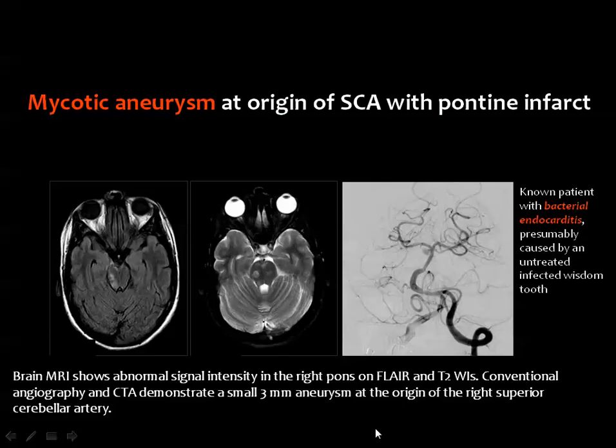And the mycotic aneurysm here is occurring at the origin of the superior cerebellar artery, and you see this very small aneurysmal sac in a patient with bacterial endocarditis.